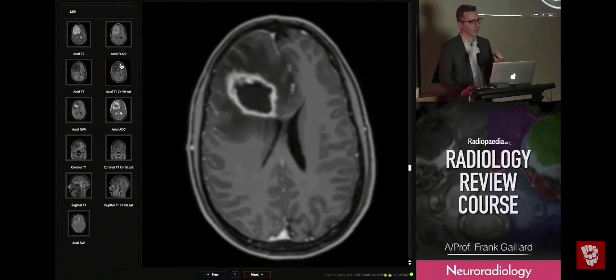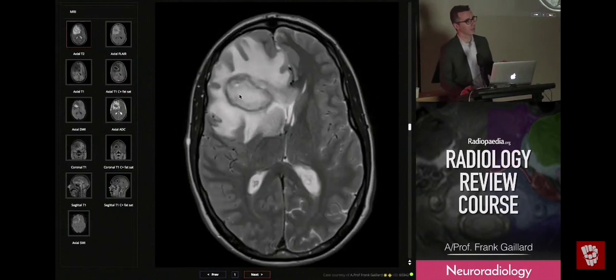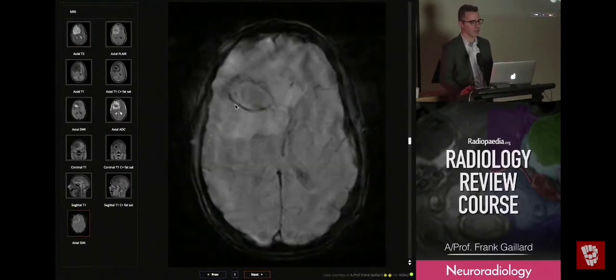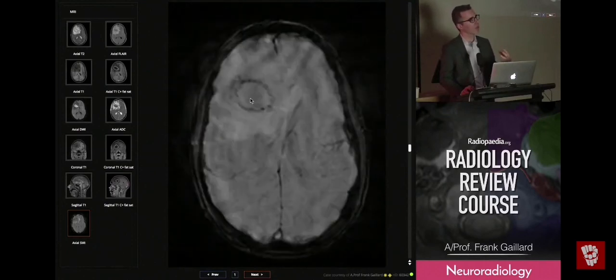And when you look at T2 weighted imaging, superimposed on the enhancing margin is a complete T2 low ring. And this is due to cytokines and free radicals released by all those monocytes in that defending border. And you can see it on SWI as well, susceptibility weighted imaging. It's very uniform. There might be tiny little areas of irregularity, but it's a complete line, not little segments, not just blotches. Again, because this is an organised physiological response, so you're expecting the process and the appearance of it to be stereotyped all the way around.